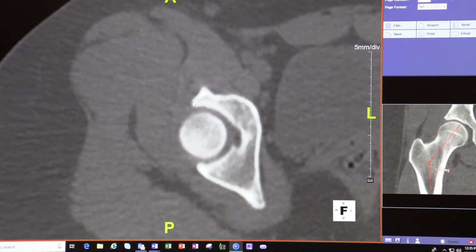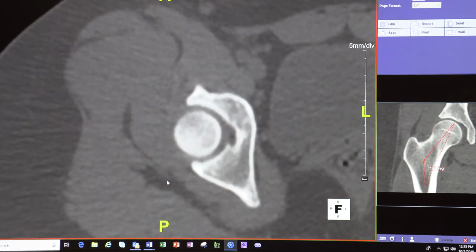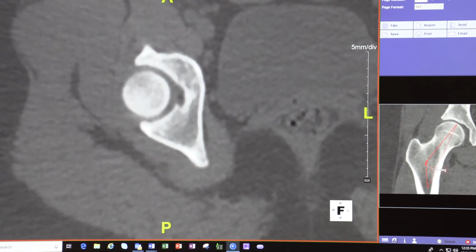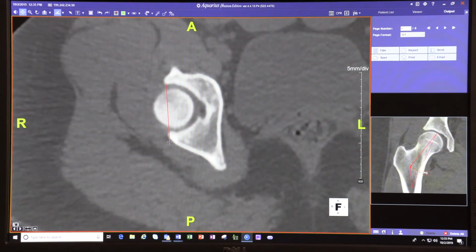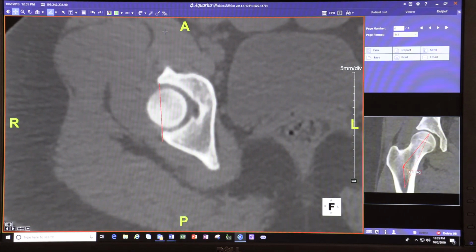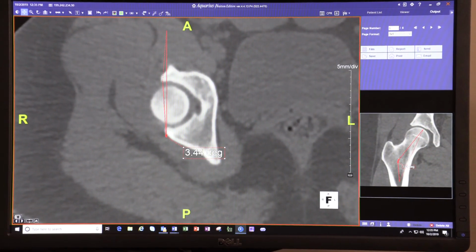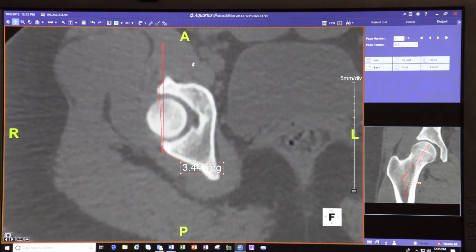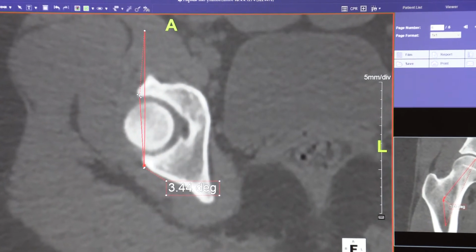So these kind of acetabula can predispose to posterior subluxation of the femoral head, and patients can feel instability when they're walking. So now, to measure that angle, it's pretty straightforward. You basically take the anterior wall, take the posterior wall, and then draw a straight line there. So here, because it's retroverted, the wall measurement is going outside to the right of that. Usually it's anteverted, goes on this side. So this measures about 3.4 degrees of retroversion.